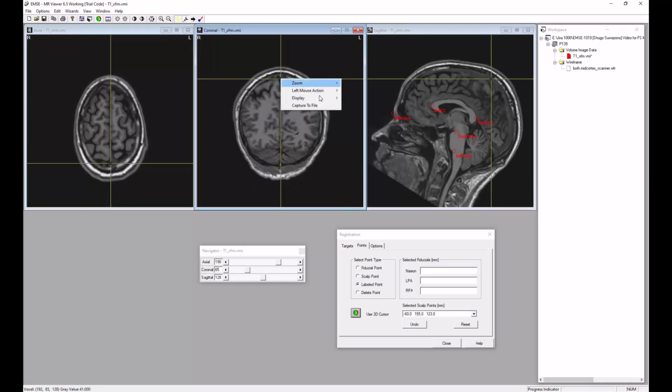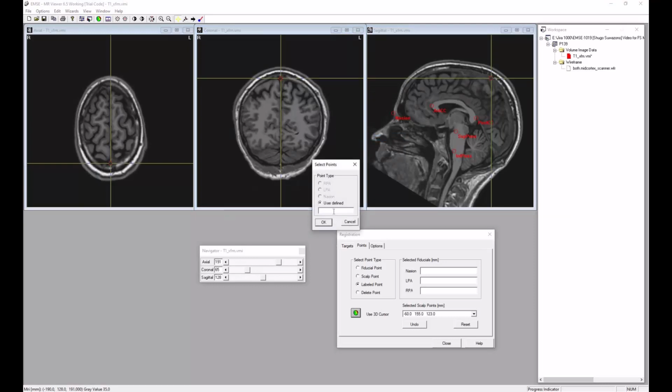And that'll be good enough. So I'm going to right click there and put our SUP brain there. Now we're going to do a posterior brain, because basically what we're doing, we're putting points superior, inferior, right, left, and anterior, posterior. We need a few more anterior, posterior, one more at least, that's going to help us in that.